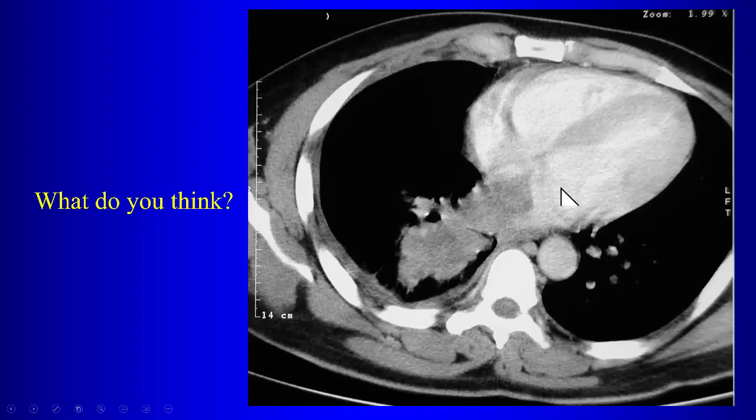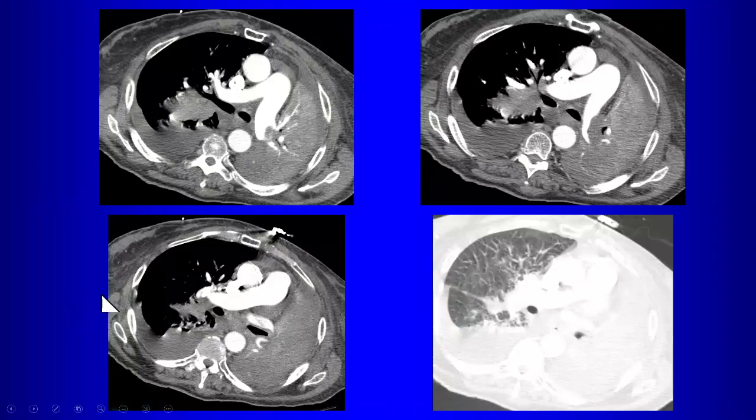Okay? So they're not going to see this part, but you will see this part, and you'll be able to say this is lung cancer that's invading into the left atrium. Okay? Here's tumor invading into the pulmonary artery, right? Here's lung cancer involving the pulmonary artery, complete collapse there of the left lung.